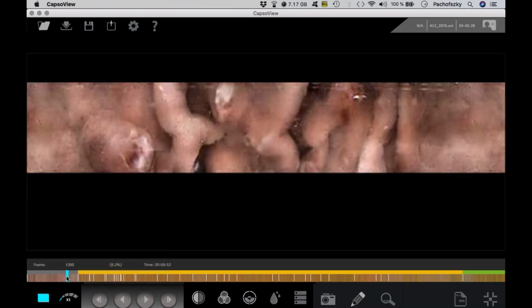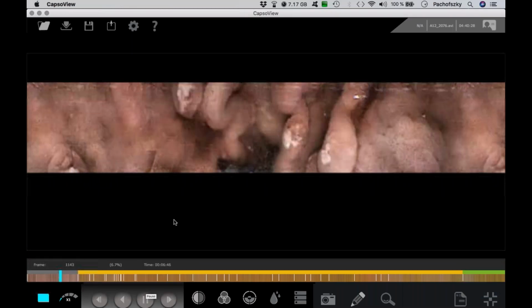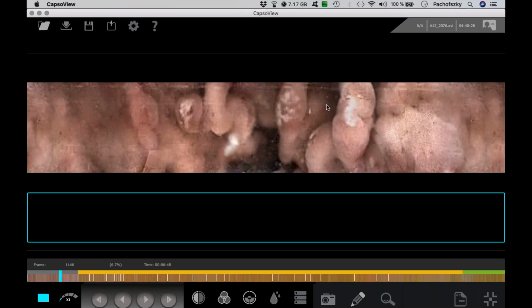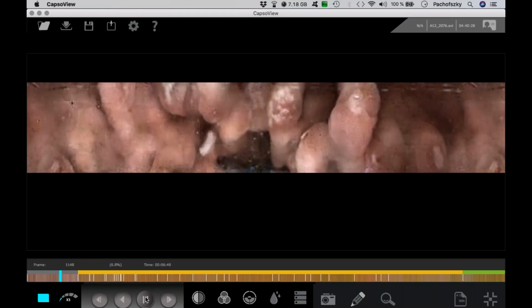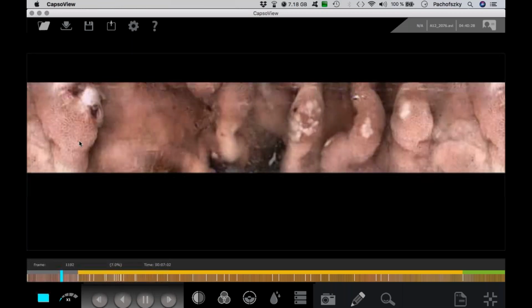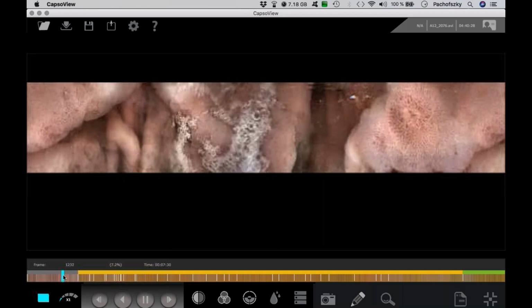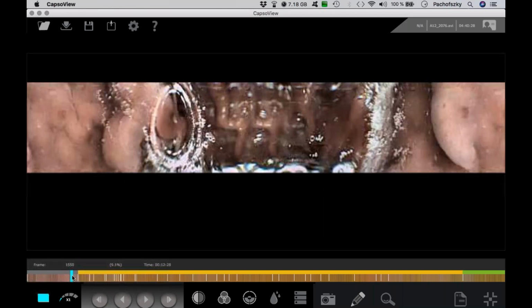From the stomach, and you can see we have in this case also a lot of lesions in the stomach. If you look at these pictures, you can see fibrin, ulceration, also in the stomach. Here also a lesion, inflammation, and some blood in this area, more blood here in this area. So we can find some lesions in the stomach.